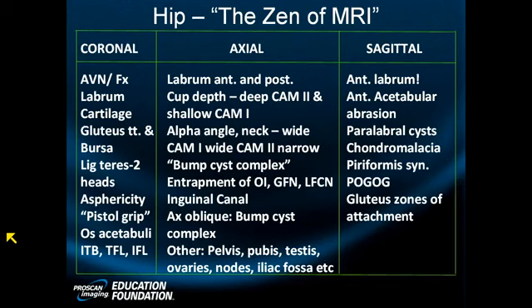The ischial head in the back and the pubic head in the front. The ligamentum teres is one of the few ligaments in the body that comes from another ligament. So it comes from the transverse ligament up to insert on the fovea capitis. So it's got a ligamentous to ligamentous origin, inserts on bone. Let's look at another one. So that's how you do a hip MR.